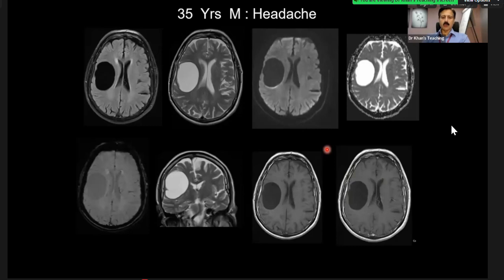Porencephalic cyst. A porencephalic cyst is a cyst in which there is basically a previous brain insult, such as infarction, surgery or trauma, etc. There was nothing like this in this case. Basically, this is the differential diagnosis of intraparenchymal cyst. So your thinking is right, but I'm not satisfied because I knew the clinical history. So over to you. Given the patient has got headache, I'm thinking this lesion is related to the symptoms. Okay, let me give you a hint.